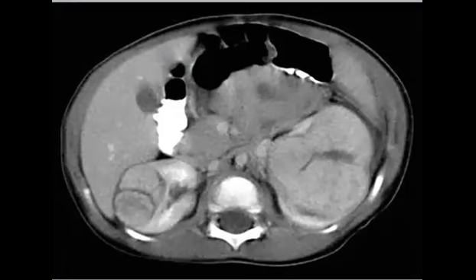So Marwa, thank you. You think about bilaterality, a bilateral renal tumor in an older child. So the most common one will be Wilms tumor. Just know that bilaterality in Wilms is around 5% of cases. Maybe, yeah, any solid masses.